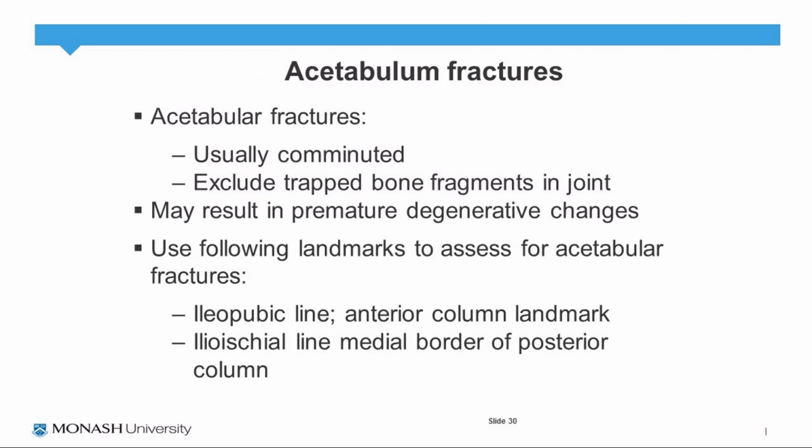And now moving on to acetabulum fractures. These fractures can be comminuted. It's important to remember that bone fragments can be trapped within the joint, and therefore CT is important to exclude any bone fragments, and this can result in premature degenerative changes. It's important to use those landmarks which I've mentioned to assess for acetabular fractures, and these are the iliopubic line as well as the ilioischial line.